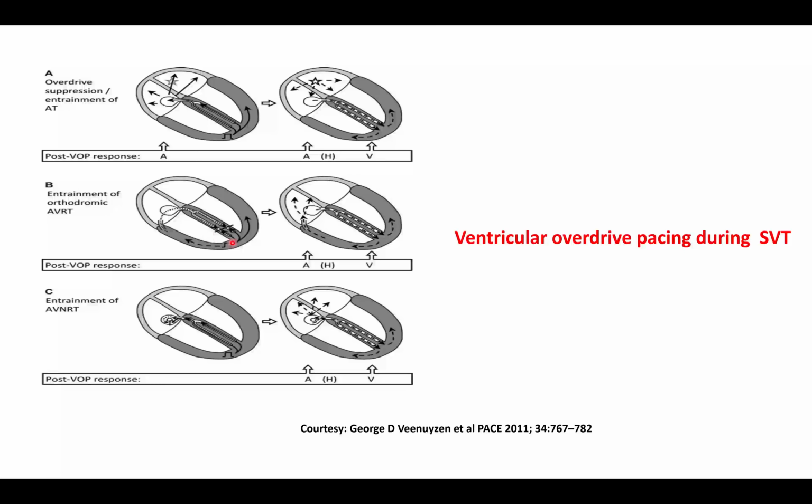So VAV tachycardia, because A and V are an essential part of the circuit. Once I stop pacing, because I'm pacing within the circuit, although it's a VAV response, the post-pacing interval, I'll show an example, will be very short because I'm pacing almost within the circuit, which is usually less than 85 milliseconds.